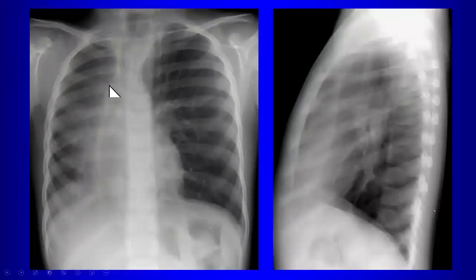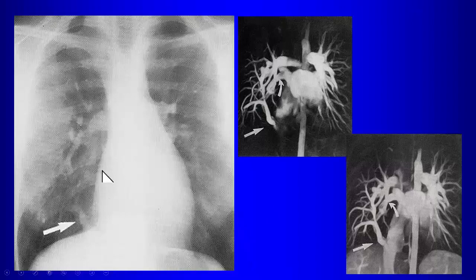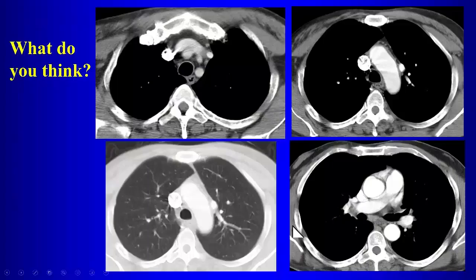Okay, so scimitar vein, small right lung. These are the findings that are associated with scimitar syndrome. And the anomalous pulmonary vein comes down and drains into the inferior vena cava. So the pulmonary venous return from the right lung drains to the IVC. That vein coming down is what gives you the scimitar sign on the radiograph. Okay? All right, so this patient has an abnormal vessel here in the anterior mediastinum.